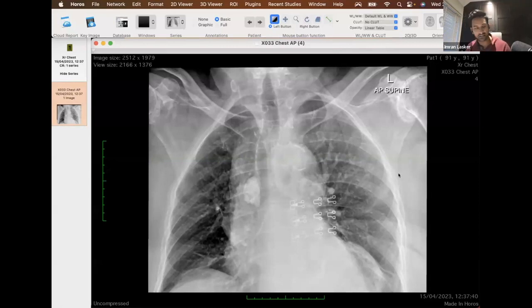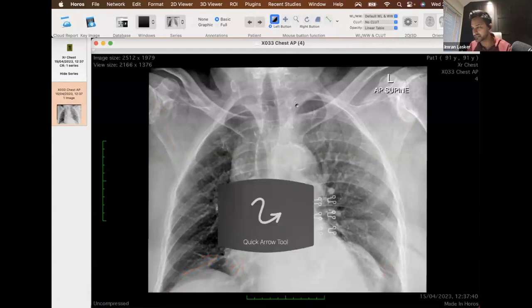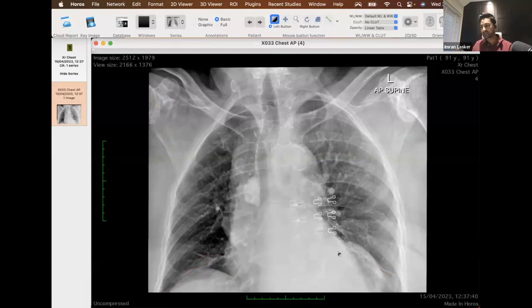They're not exactly a young patient. You can see that there is some significant osteoarthritis involved in both glenohumeral joints. See that little band there? That's a thin band of atelectasis, maybe a few more thin bands of atelectasis. Everything looks okay. So I would say this patient is in a rotated, slightly bent over, kyphotic position, and you've got this almost uniformly calcified lymph node located within the right mediastinum. Differential diagnosis would be, et cetera, like I say.